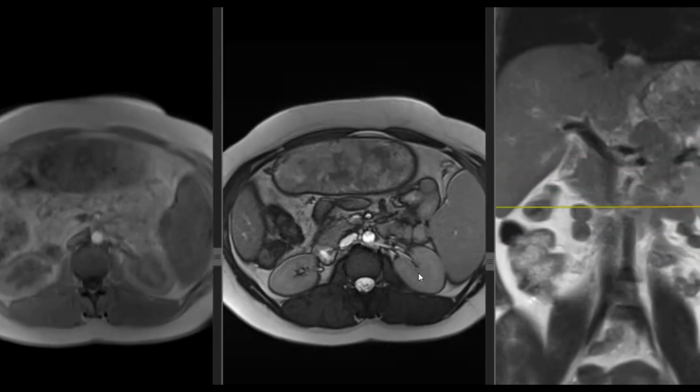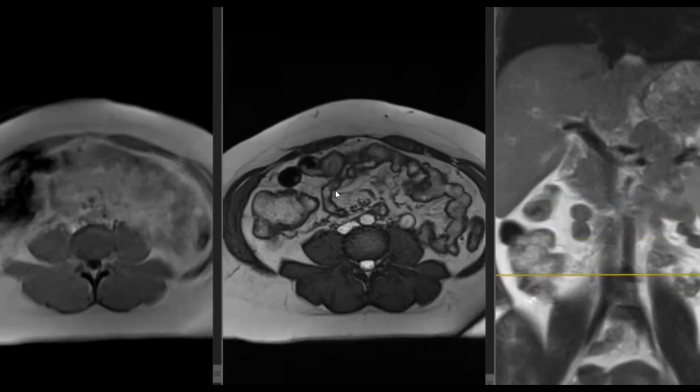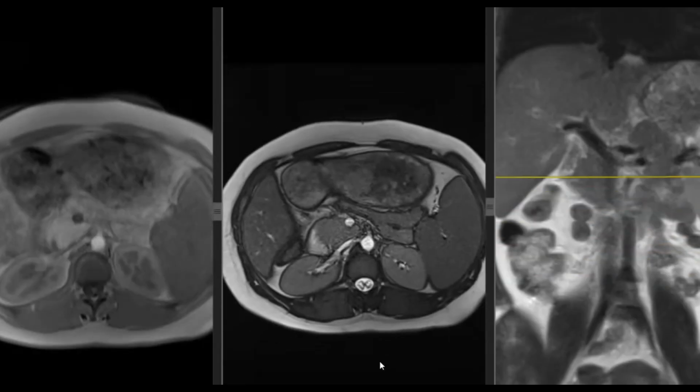Listen, I always tell you, never diagnose SMA syndrome in a fatty patient, in someone who has fat. You can see her belly, it's big. See the fat here. This will never be an SMA syndrome. Okay? Keep that in mind.